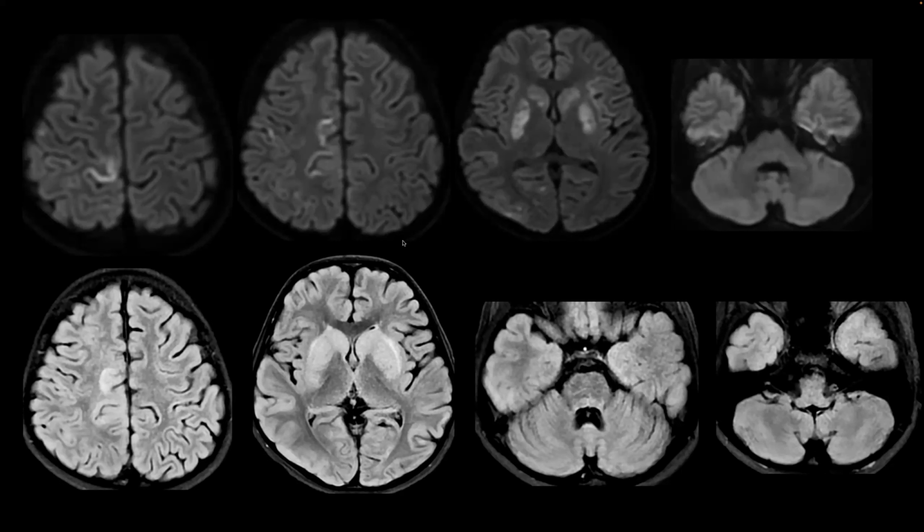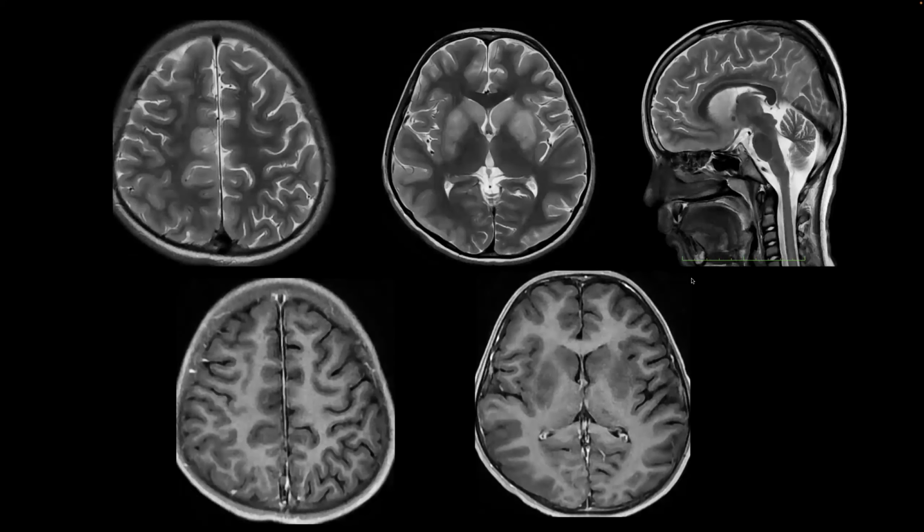The first one had multifocal lesions predominantly along the cortex and some areas of restricted diffusion, but the deep brain nuclei were relatively spared. But on the second MRI, you can appreciate that there is again some cortical involvement, some area of restricted diffusion. But now the changes are more predominantly in the deep brain nuclei involving the dorsal striatum, demonstrating restricted diffusion. You can appreciate again the edematous changes on the FLAIR sequences. The external capsule also is involved, the anterior limb of the internal capsule also involved, and some degree of patchy edematous changes in the brainstem, the pons, and the medulla.